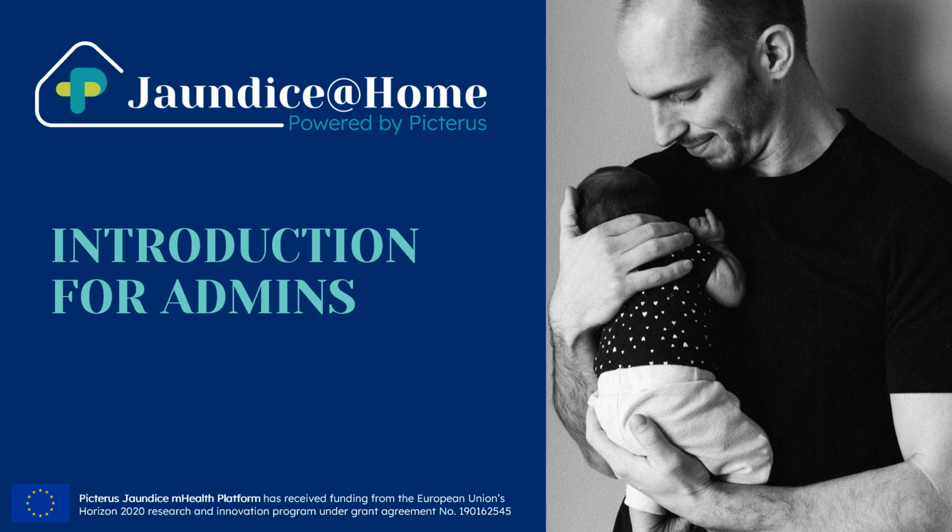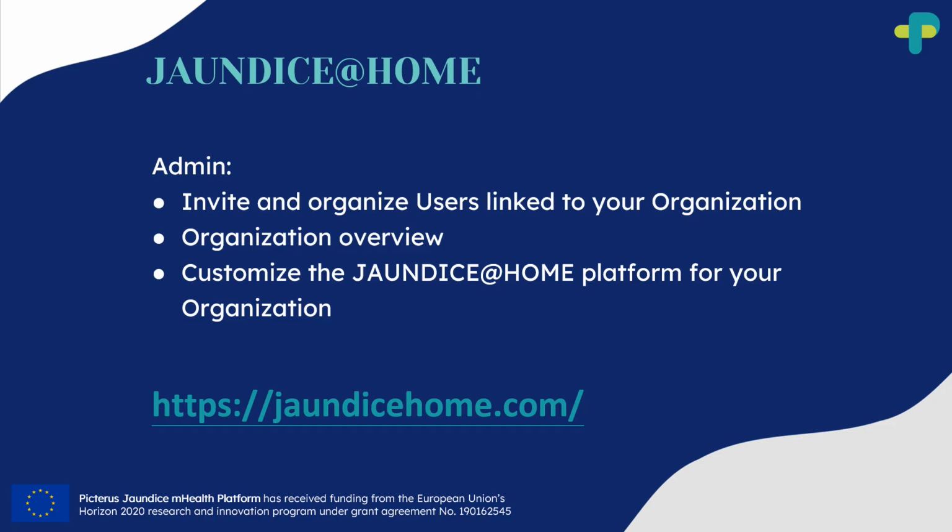In this tutorial, we will take a look at the administrator role for the Jaundice at Home platform. As an administrator, you can invite and organise users that have access to your organisation on the Jaundice at Home platform. You have an overview of the organisation and can customise the Jaundice at Home platform according to your needs. You can log into the Jaundice at Home platform using your credentials at jaundicehome.com.